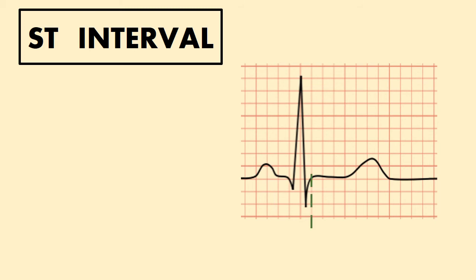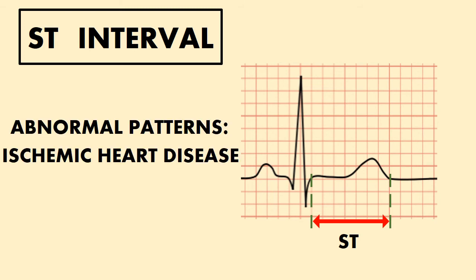ST interval extends from the beginning of the ST segment until the end of T wave. Characteristic patterns appear in ischemic heart disease.